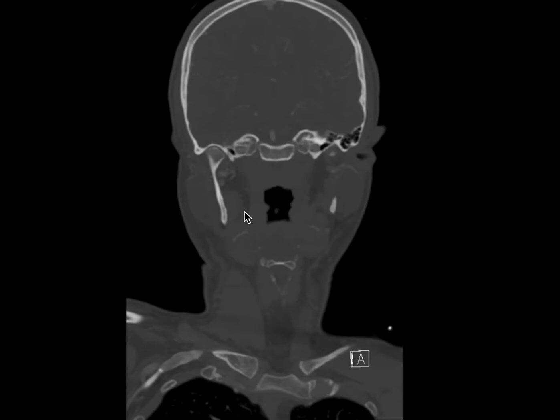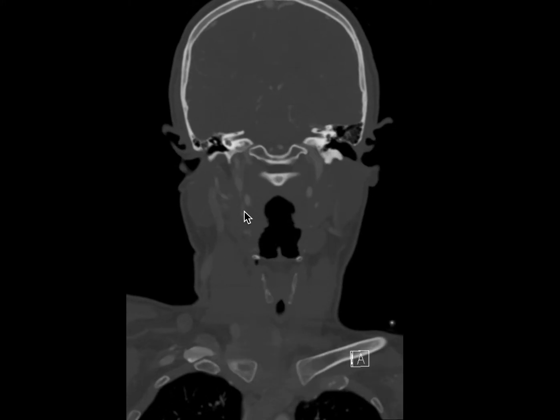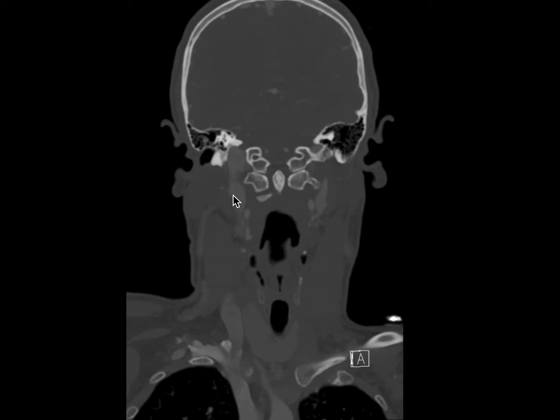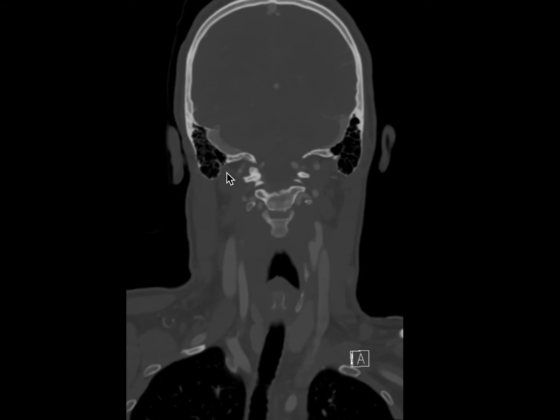Scrolling back posteriorly now, next I'm going to point out the occipital artery. The occipital artery is going to come off at this point here, and then as I scroll posteriorly, we'll see it work its way up, posterior to the mastoid process of the temporal bone here. So here it is going out to the occiput.